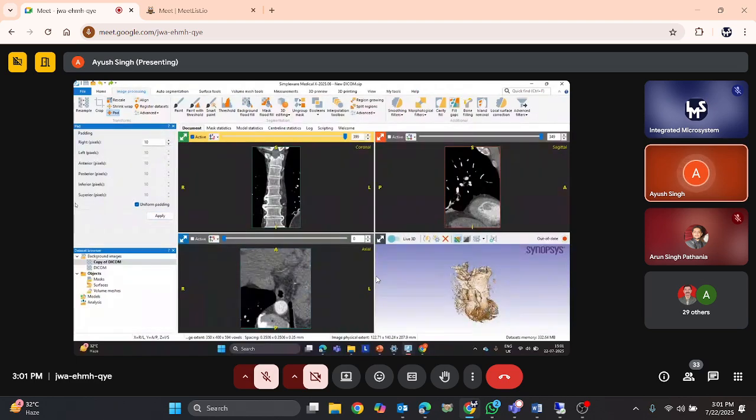But why do we do this type of padding? For example, if we are bringing in any part and it is not getting accommodated in my current view, the easiest option is to increase the padding size in whichever view is required. We just need to uncheck this uniform padding. And for example, we can increase in the right or left pixels and all other settings are 0.